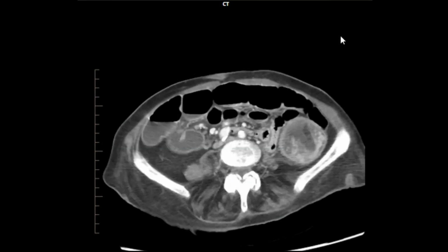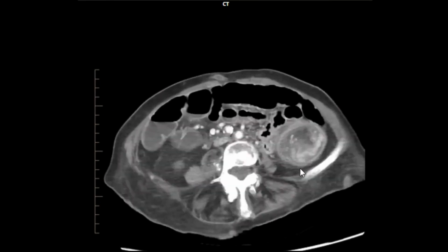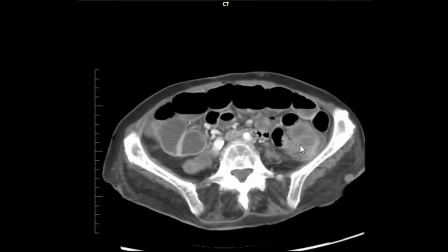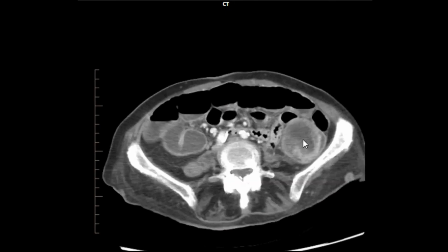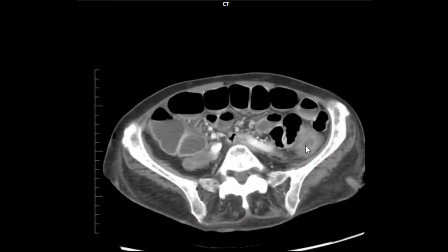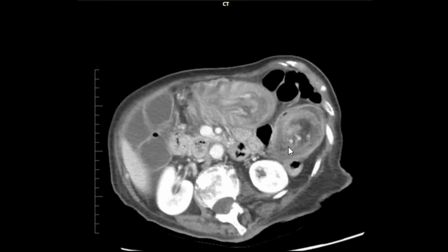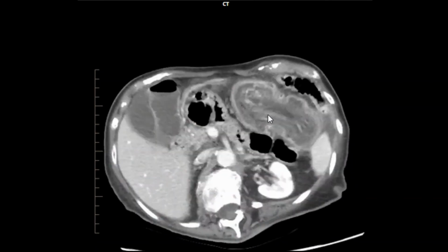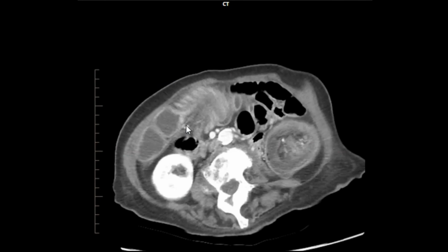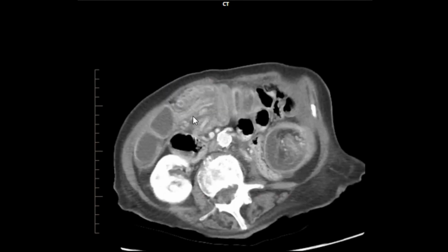This was a case of colonic intussusception, and we can see here, I followed it through, but you'll just have to believe me that the descending colon, distal portion, is here, and this is all intussusception of the large bowel extending to the cecum, and this was secondary to a cecal adenocarcinoma.